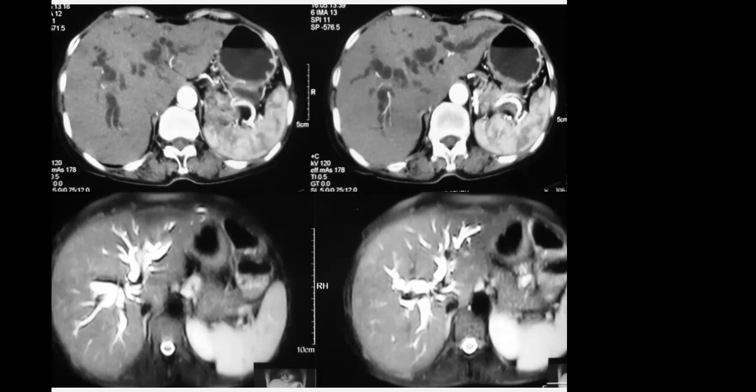Here are the differences between these two imaging modalities. In this particular case, this is a T2 weighted sequence, where you see the dilated bile ducts appear bright, and the fluid inside the spinal canal, or CSF, appears bright. But in a T1 weighted image, you would see all these structures are hypointense, similar to the intensity we see in CT scan.